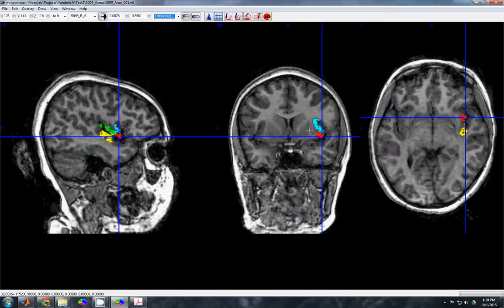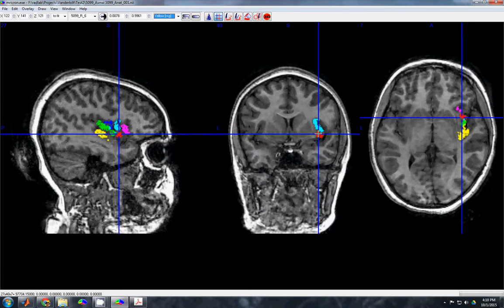Right? And then as we go in, this part right in here is going to be number 8, because you see there's that white matter dividing it right there, if you can convince yourself it's there. If you really don't see a distinction, then you just make it all number 8. But I'm going to save this as number 7.